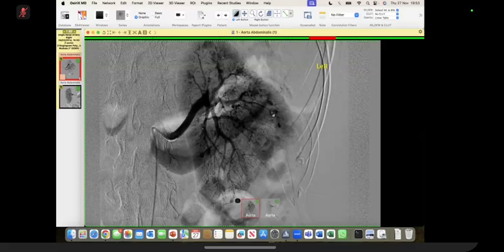Why does microhemorrhage happen? What happens? So the patient has vasculitis, and the vessels are very friable. So that can cause microhemorrhages, which have led to the perirenal hematomas in bilateral kidneys. You mentioned some outpouchings. What do you call them? These are the microaneurysms, sir. Okay, thank you. Yes, sir.